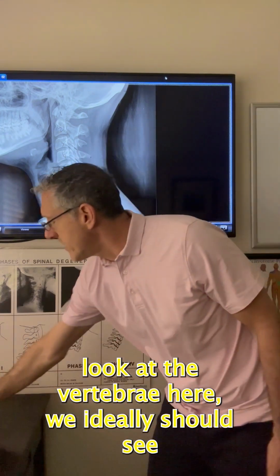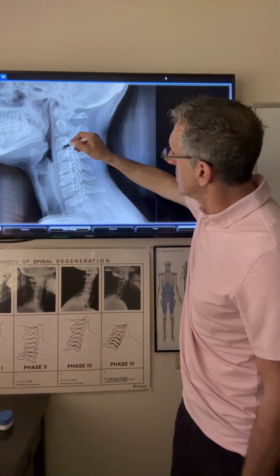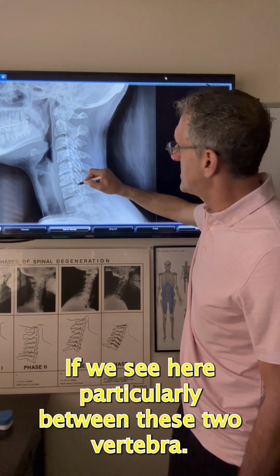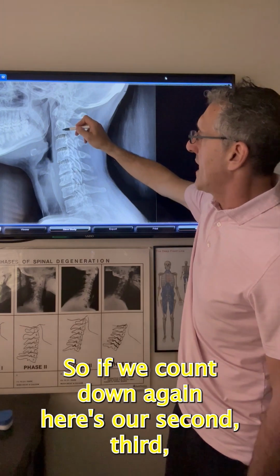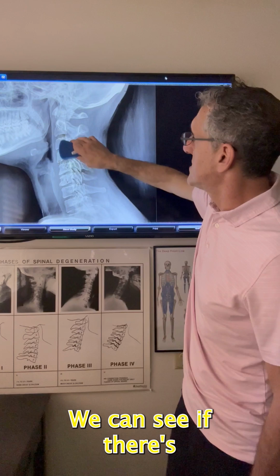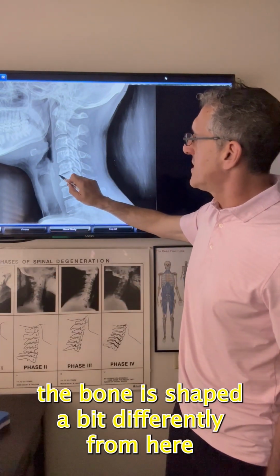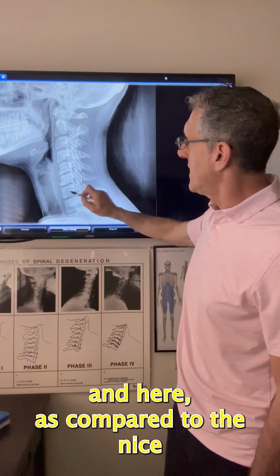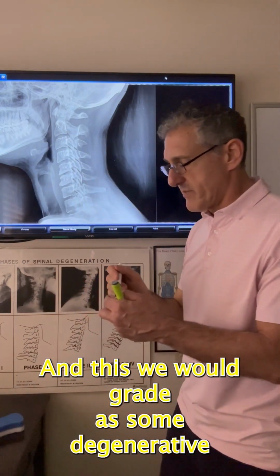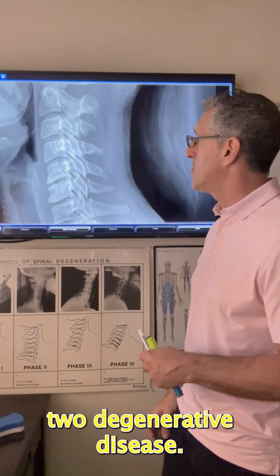But when we look at the vertebra here, we ideally should see all of the vertebra relatively have the same width and shaping of the disc. If we see here, particularly between these two vertebrae, so if we count down again, here's our second, third, fourth, between the 5th and 6th cervical vertebra, we can see that there's a tremendous change in the width of the disc. I can also see the bone is shaped a bit differently from here and here as compared to the nice squaring of the bones above and below. And this we would grade as some degenerative disc disease. If we were to grade it on a scale, we would probably call it a phase 2 degenerative disc disease.